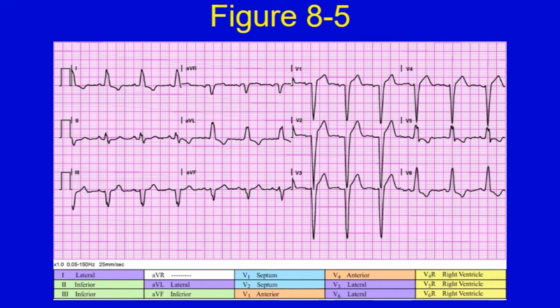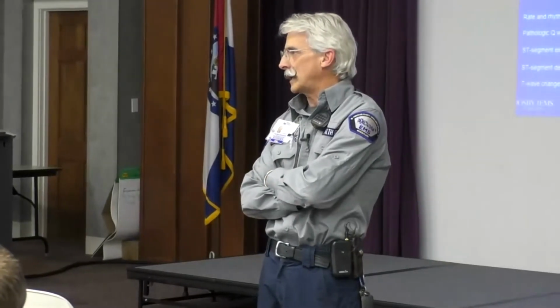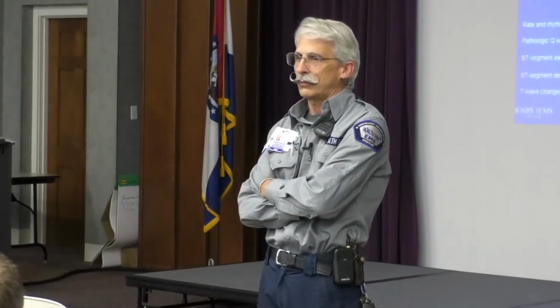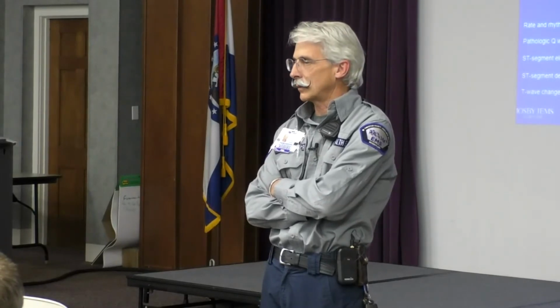So do we have a bundle branch block with this one? Yes, I believe so. Who cares about a bundle branch block? What does a bundle branch block do to leads V1 through V4 whenever you're doing a 12 lead?